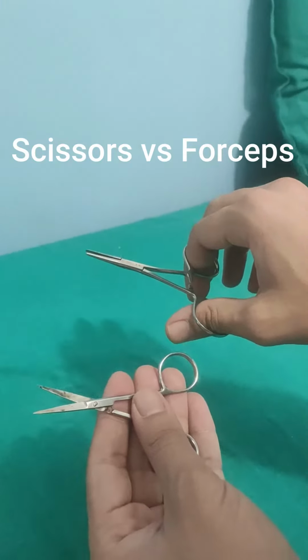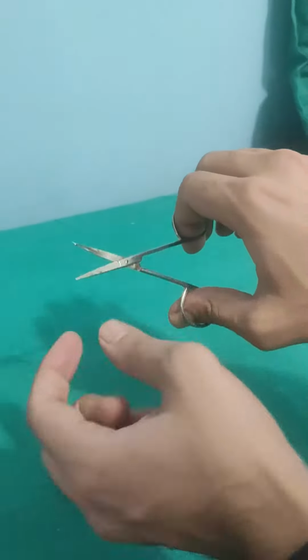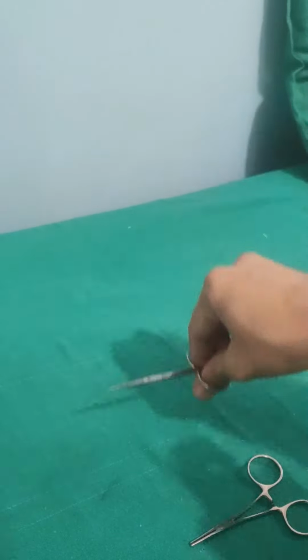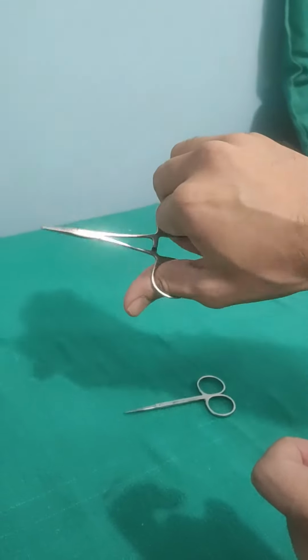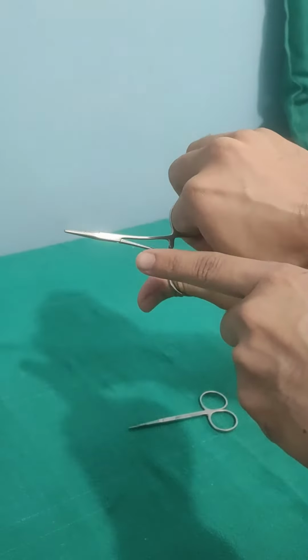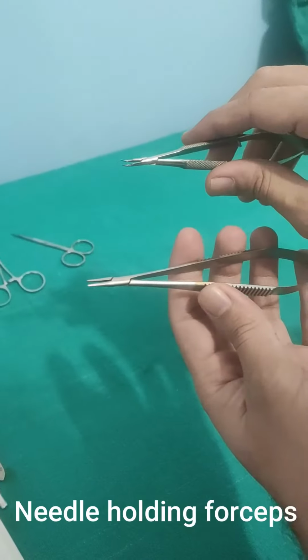Starting with the differentiation of forceps and scissors. The two prongs of these equipments cross each other, so it is a scissor, while the two prongs of these instruments do not cross each other, they just come alongside of one another, so it is a forceps.